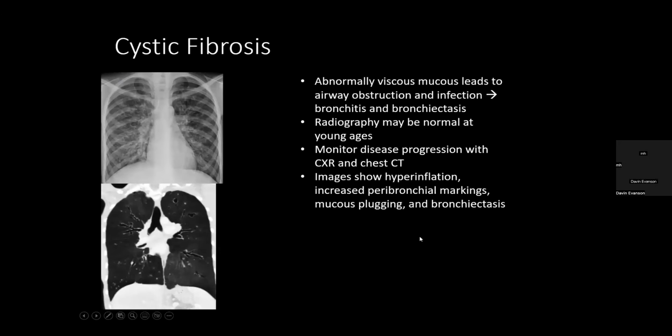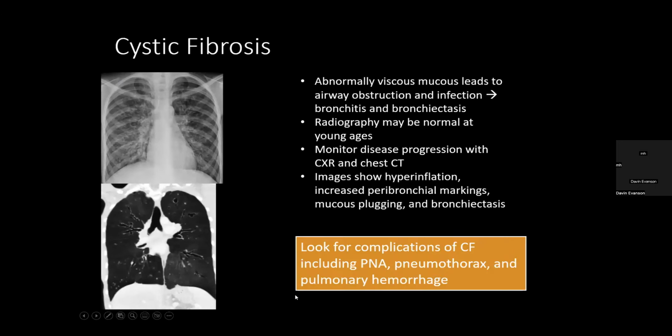Cystic fibrosis. We have a big population here in Pittsburgh. The X-ray findings, the CT findings. Usually you have the history, but we're looking for the complications: pneumothorax, pulmonary hemorrhage.